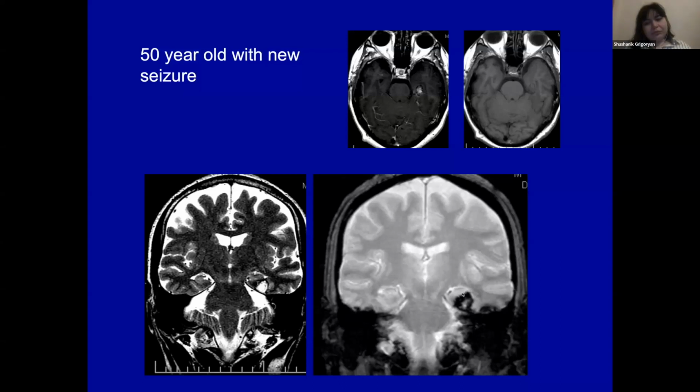And so this may look, for all intents and purposes, like a mesial temporal sclerosis case, both clinically and electrically, but these seizures are going to be related to the cavernoma. Now, this is important because this has a different surgical approach and a lower likelihood of successful surgery than patients with mesial temporal sclerosis.